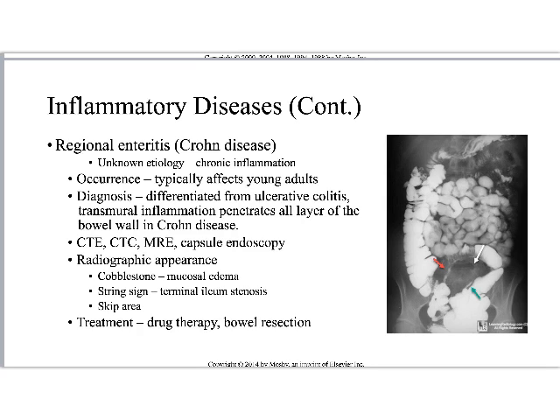It's in the area of the ileocecal valve, the terminal ileum, which I know is in the right lower quadrant. Again, it's a string sign. The barium's just barely slipping through. So it's important that it's a string sign, but it's also important where the string is. The string is in the area of the terminal ileum, the end of the small bowel.